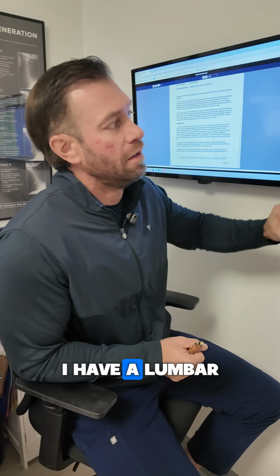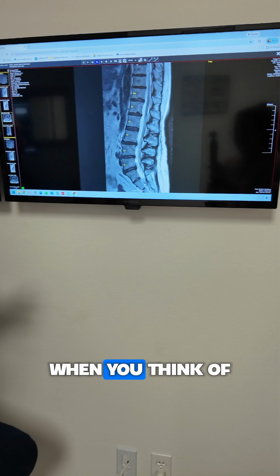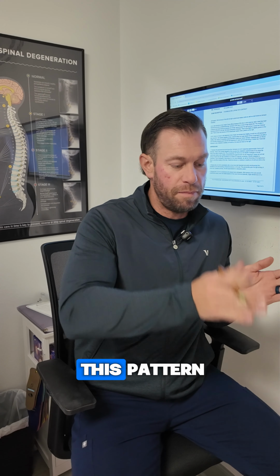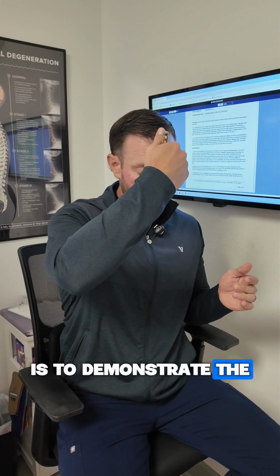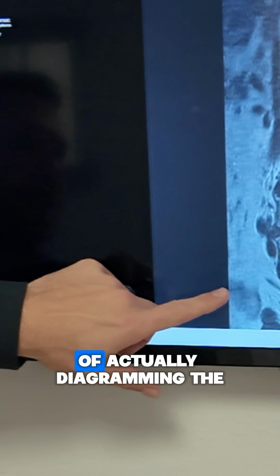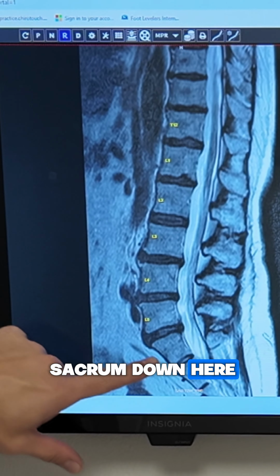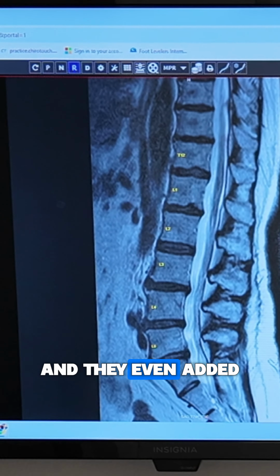I have a lumbar MRI right here, and when you think about MRIs, they're like cross sections. They're cutting it in this pattern right here on the body. What we have right here demonstrates the most central cut, which is going to give us the best and most information. They did a really good job of actually diagramming the lumbar spine. You have the sacrum down here, then you have L5, 4, 3, 2, 1, that makes up the lower back right here, and they even added T12.